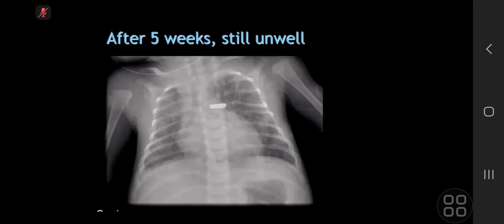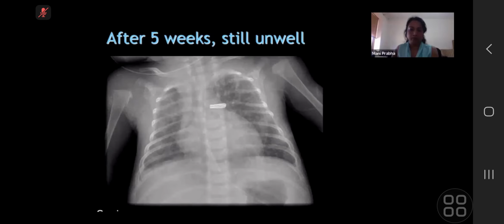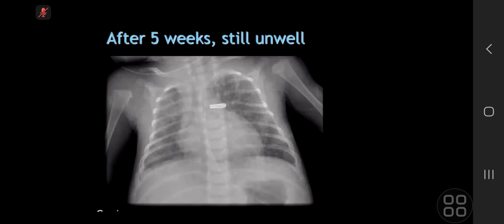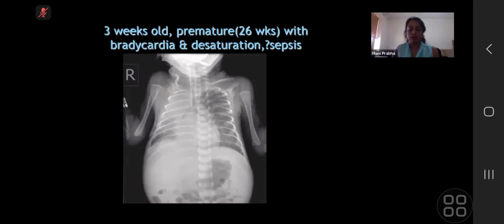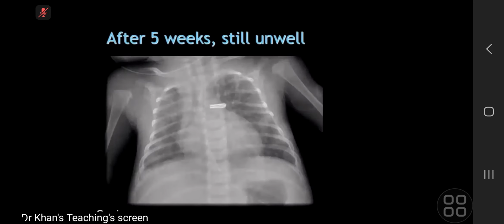So as the patient was okay, so it could be there are translucencies. I can see linear lucencies in both of the lungs. So either I will ask for the previous history if the child is on any ventilation. So on the basis of these findings, the first differential is pulmonary interstitial emphysema.